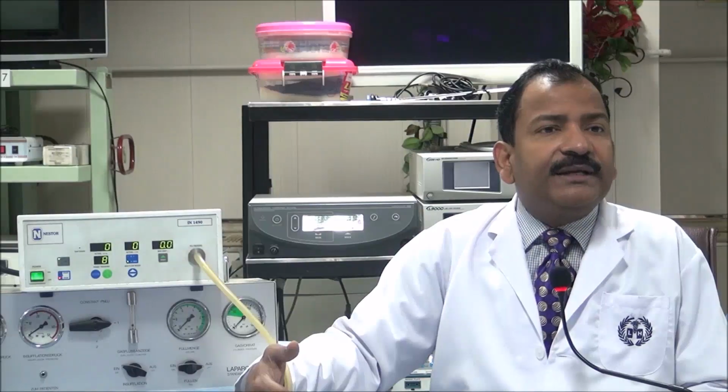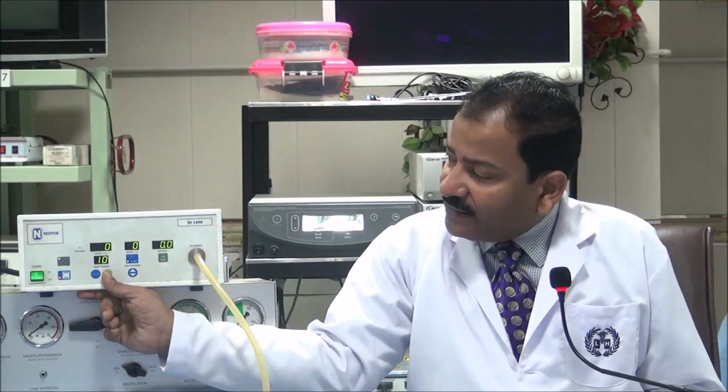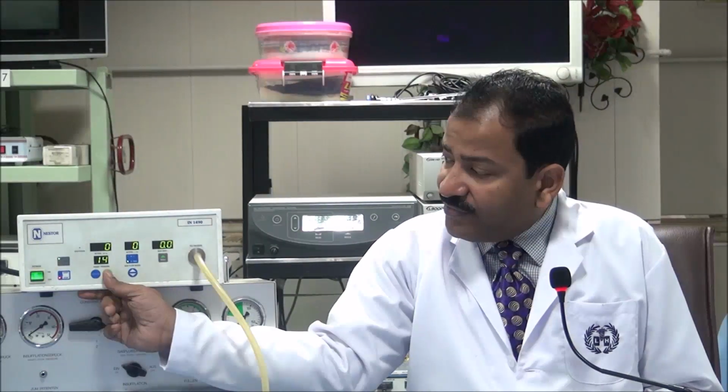Because your patient is not intubated. If you put more pressure, the patient may feel discomfort because the diaphragm will be pushed up. The patient will feel suffocation and cannot breathe. And there will be a lot of irritation at the shoulder tip. If you are performing operative surgery under general anesthesia, then you can initially try to work at 12, and if you are feeling a little difficulty, you can go to a maximum of 15.